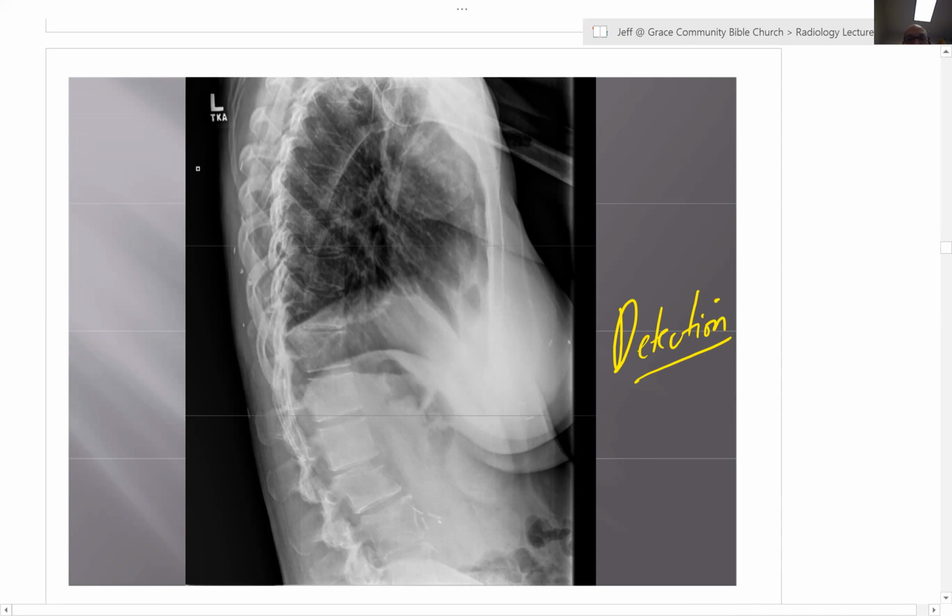Where's the finding? Got a compression fracture, that upper dorsal spine, right behind the humeral head, it looks like. Okay, so it's really tough to tell if that's compressed there or not. I'm with you. It might be. I think we'd almost need a swimmer's view to tell for sure. Keep looking through the rest of the spine. There's another finding that might have ended up being bad in this case. Keep looking. L2? Yeah. Okay, so I'm just going to say right up here doesn't look great.